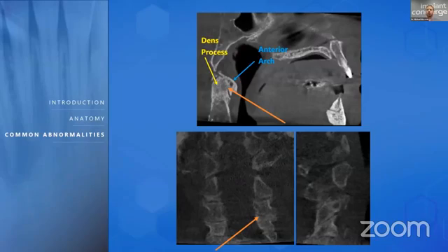And here, this is a coronal view. Of course, the more times you look at a cone beam CT, the more comfortable you become looking at it. I know it's very difficult to give you just two snapshots and for you to know what you're looking at. But that's the articular facets of your cervical vertebrae, not the body, not where the disc is, but the articular surfaces, both on the left and right side of the bodies of the cervical vertebrae. But the exact same findings that you're going to see in the TMJ are basically transferable to when you're looking at the condyles.